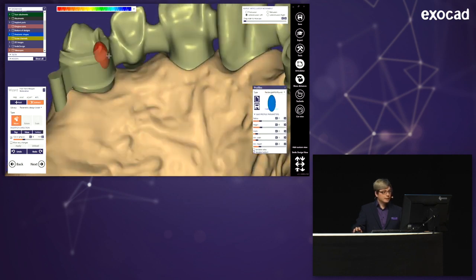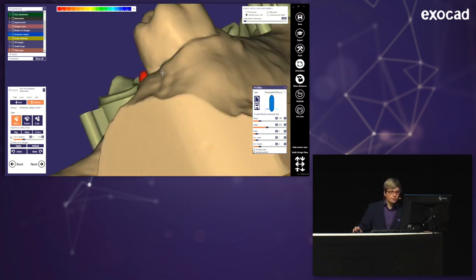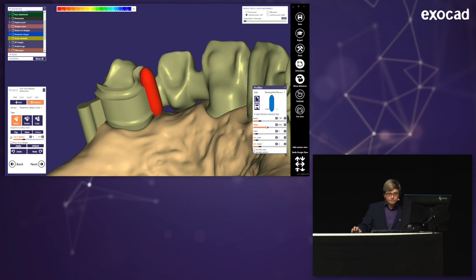Because in this, I can actually place it. It's also parallelized. And then now I can even change the parameters. And if I change the height, you will see it gets longer. And it's a bit of a round shape. And I can use parameters completely used for the rotation lock I want to have at the end. So for the width, I'm going to choose 1.5. And for the radius, because I want to have a real smooth radial up there, I'm going to choose half of that.